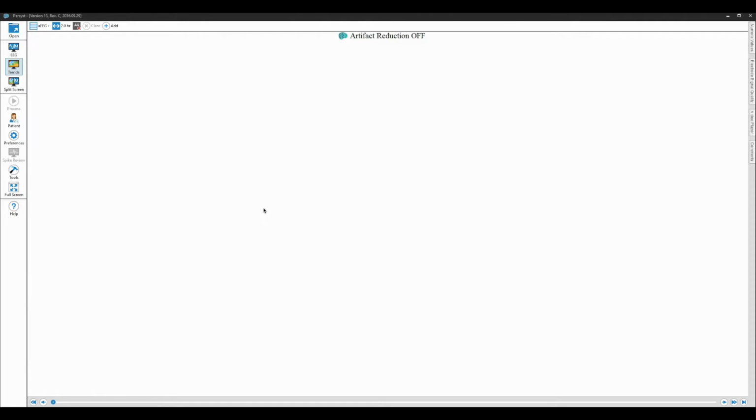In this video, I will be doing a short demonstration of Persyst 13, which is the latest version of our software. This demonstration will be done using a standalone version of Persyst, although frequently you will be using Persyst in an integrated fashion with the EEG manufacturer's software.